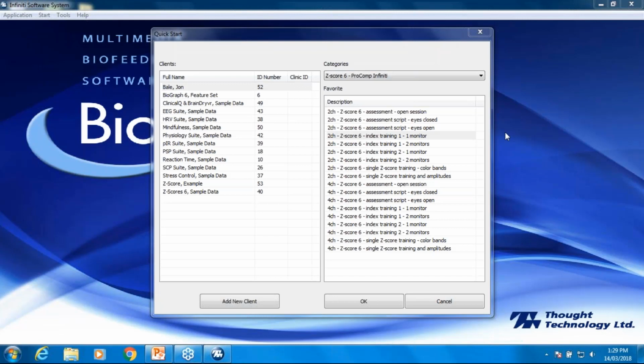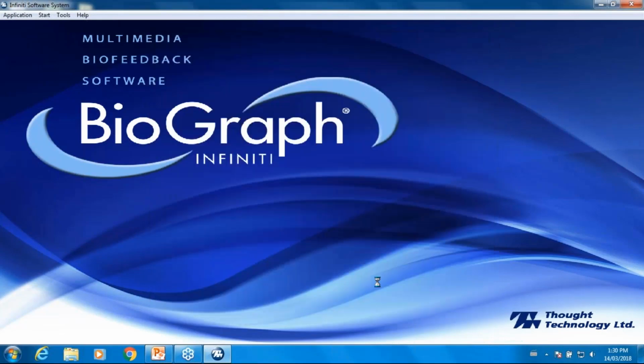So if they have attention issues, you might want to focus centrally or frontally. If they did have concussion issues, you might want to focus on the site where they're hit if they know that. A lot of clinicians actually just choose to do an evaluation at 2 sites and then move the electrodes and look at another 2 sites and so on. And so it's really up to you to decide where you place the electrodes. We do the rest of the work of the interpretation of data and figuring out what is too high and what is too low. So let's have a look at what it'd be if you trained a single statistic.